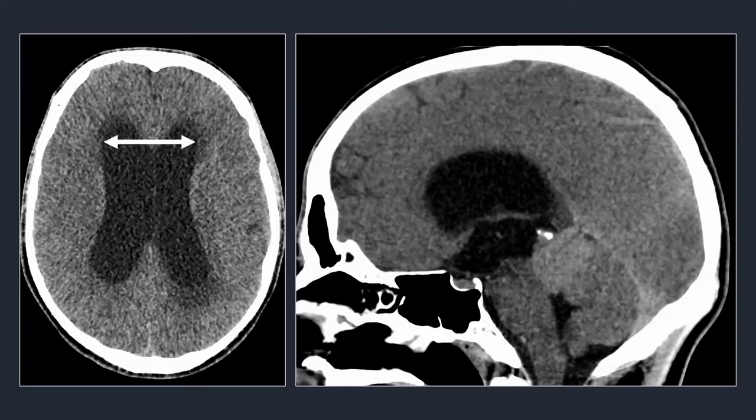Let's take a look here. We clearly have widening of the lateral ventricles, clearly seen also on the sagittal plane, as well as widening of the third ventricle. I have told you that if you're dealing with hydrocephalus, look at the outlets or the narrow passageways. Now, the foramen of Monro cannot be involved because we have both widening of the lateral ventricles and of the third ventricle. Let's look at the cerebral aqueduct.